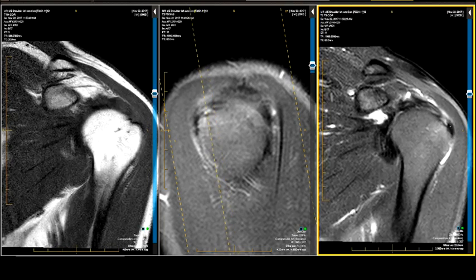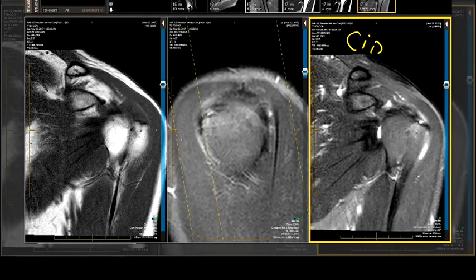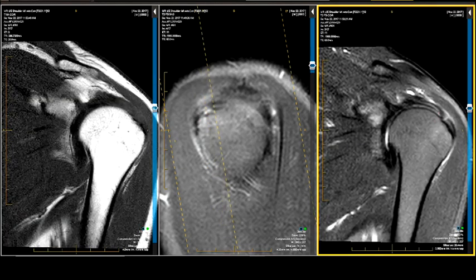Well, you could have an intrasubstance concealed tear right here, like that didn't penetrate. And that would be called a concealed interstitial delamination footprint tear, or a CID. If it penetrates the bone, then it's a CID with a rim rent. What if your tear then decided to do this? You'd say I have a CID with a rim rent, say it's in the bone too, but with medial interstitial extension. Now that is not an articular-sided tear. There's no joint space there. Joint space doesn't start till over here. That's the footprint. That is a humeral-sided tear, not, I repeat, not an articular-sided tear.